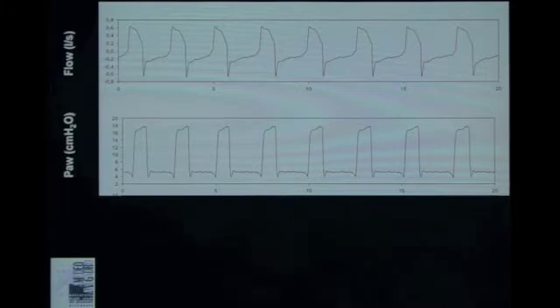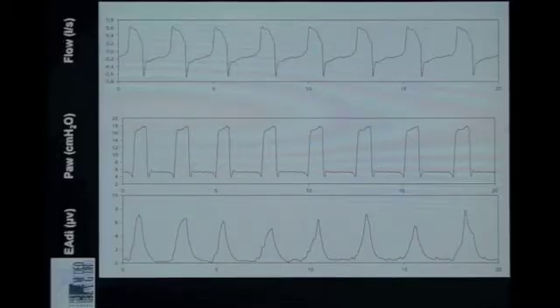And you know, when you have a situation like this, I guess all of us would bet that there is a perfect synchrony between the patient and the ventilator. Everyone says, no, no, no. And in effect, it's perfect. I tricked you. And it is actually perfect.